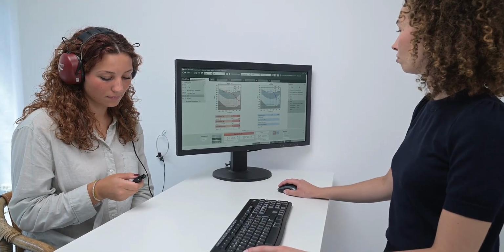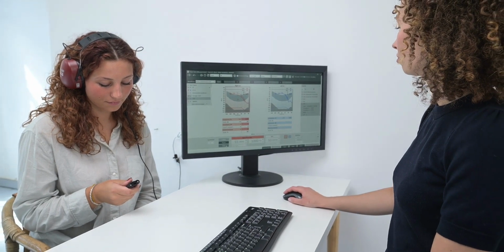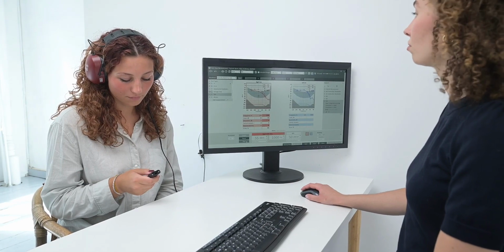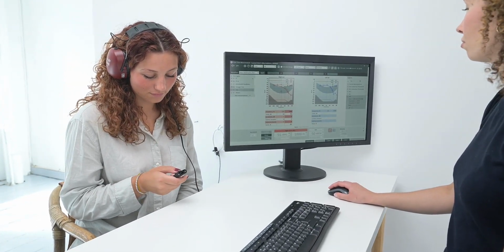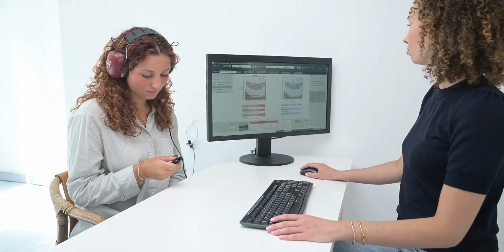The Measure software is designed with audiologists in mind. Every test and setting can be extensively customized to meet the needs of any clinic. Not only does this save clinic time by avoiding software adjustments during testing, but it allows for seamless assessments, ensuring the ease and comfort of your patients.